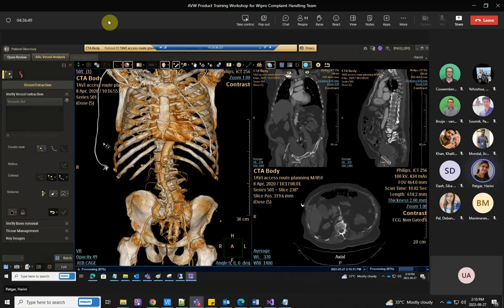What else I can tell before this? And these are all the common tools. The upper panel, what you see, this you will see across all applications in general, whether it's MR or CT. Irrespective of the application, these tools are provided, like rotating, panning, zooming, 2D views, all those things. And these are all something specific to vessel related. Say for example, this is my vessel, right? So vessel, if you cut in a cross section and the top view is like a circle, like see, this is a circle. This might be a vessel for you. So the contour, in the sense, the lumen and vessel contour, it is the outer layer what it gives.